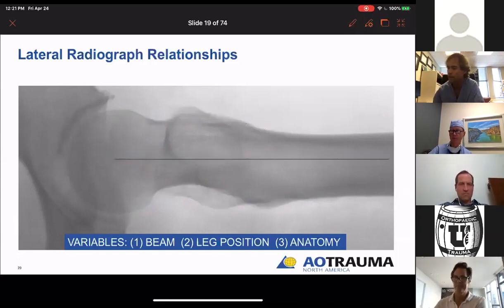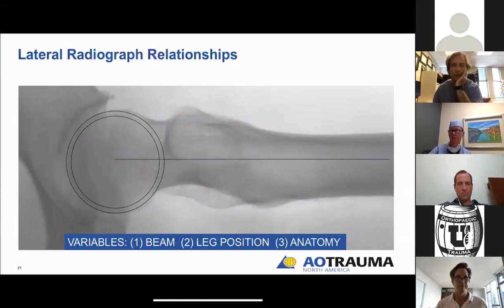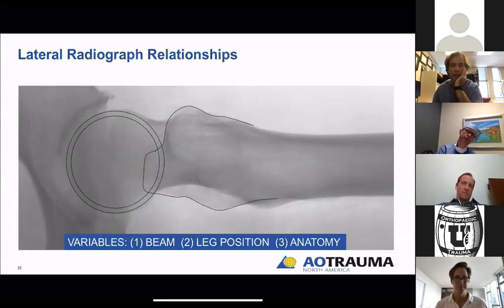All right, so collinearity, standardized x-ray, head, neck, shaft. Sphericity of the head is usually reasonably preserved. Shape of the greater trochanter, typically a little bit more proximal as you get more posterior, with a special bump as you get posterior closer to the lesser. It's a wide structure, very different than the piriformis fossa, which you can clearly see there. This is one of the reasons that many of us like piriformis fossa nailing as opposed to trochanteric nailing, because there is a clearly defined point that we're going for on an x-ray on piriformis nailing as opposed to this.